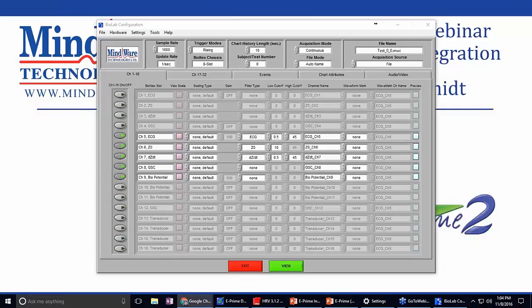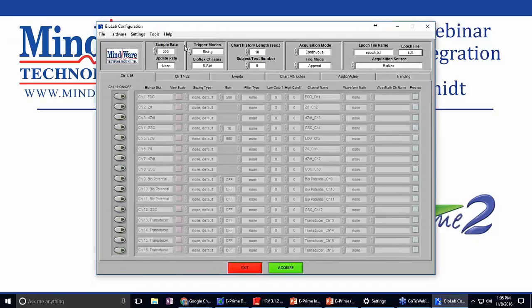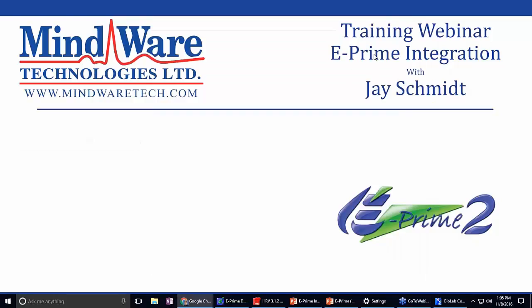Okay, next question is, how does a falling edge trigger work, and when should I use it? So let's switch back over to the BioNex, and I'll show you what setting we're talking about. If we're back in trigger mode, I basically demonstrated rising. We also have a few other options here, including falling. So the question is when you might use a falling edge. I can show you this within the graphic that we showed earlier.